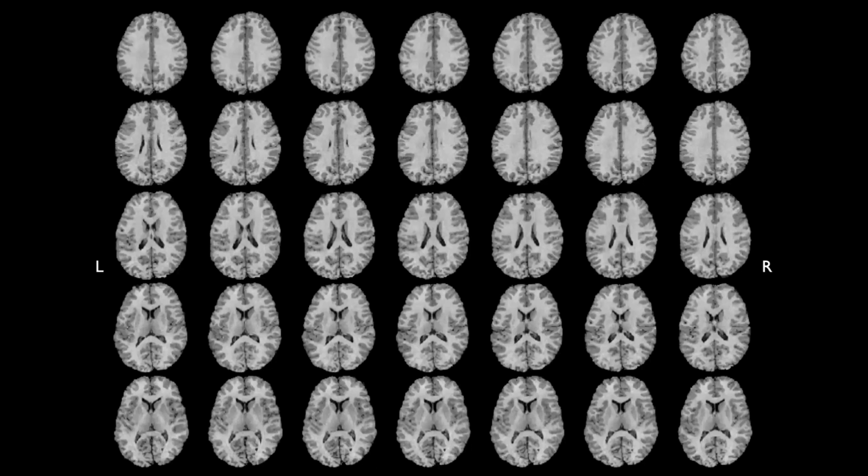And here are the preoperative T1 weighted MRI. You can take some time to look at it and to find a lesion in this patient.